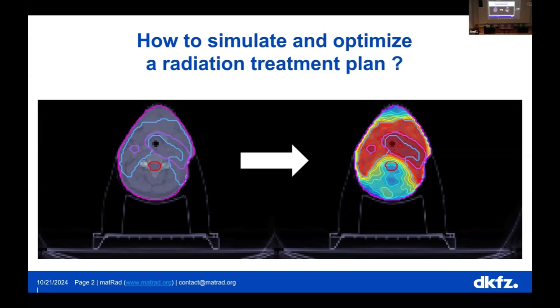already an image that is lined up, has its contours drawn. So here it's kind of what you see. You see a contour of the patient like this. You see targets. So we have here a CTV, like a primary PTV already outlined. The CTV and the GTV are no longer shown, and a lower dose PTV and also an organ at risk. And based on this, we want to figure out how to get to the dose that might treat this patient well enough.